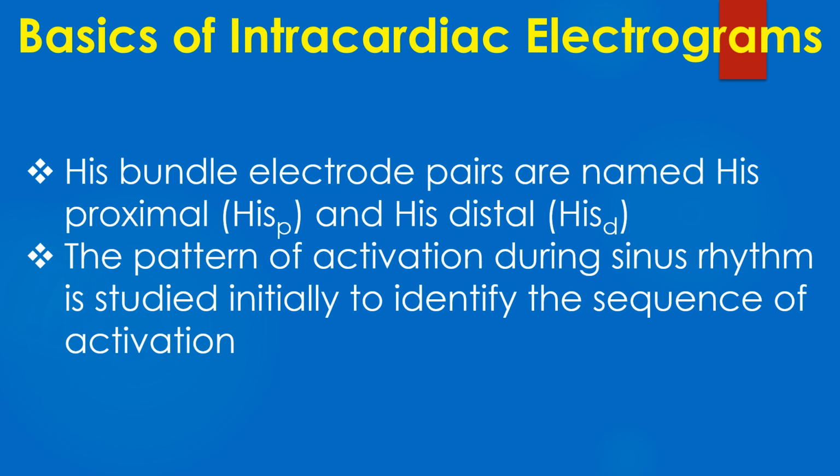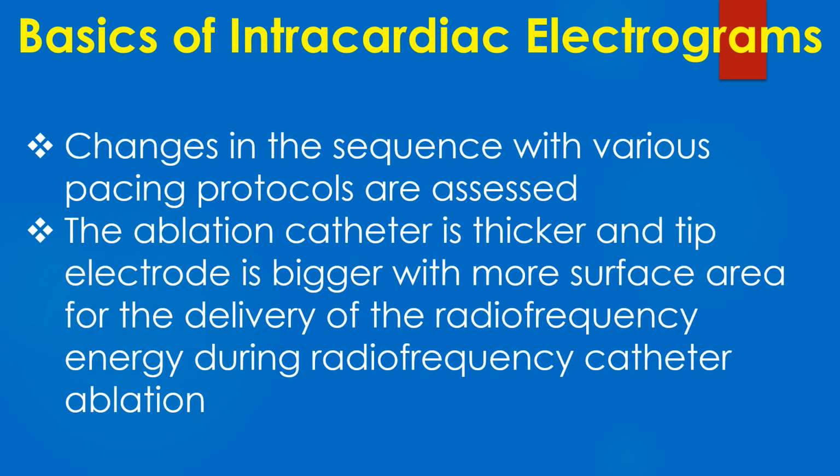The pattern of activation during sinus rhythm is studied initially to identify the sequence of activation. Changes in the sequence with various pacing protocols are assessed later. The ablation catheter is thicker and the tip electrode is bigger, with more surface area for the delivery of the radiofrequency energy during radiofrequency catheter ablation.